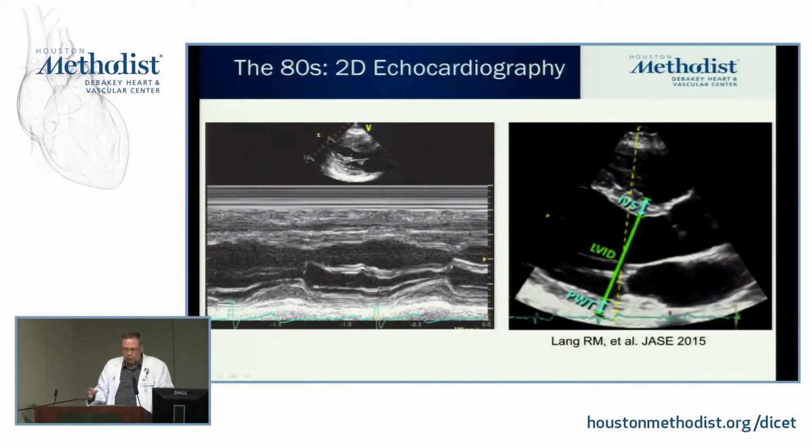Now, the fractional shortening of diameters of the LV is very old. When I started doing echoes in 1971, '72 actually, it was already being measured by echocardiographers. So it was one of the very first measurements of LV function, in M-mode, looking at the diameters and fractional shortening.